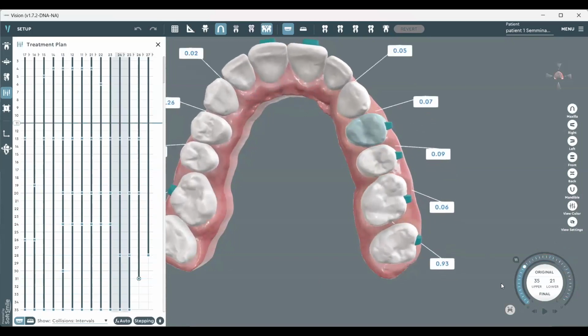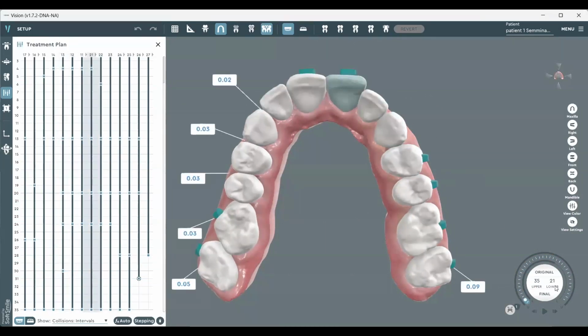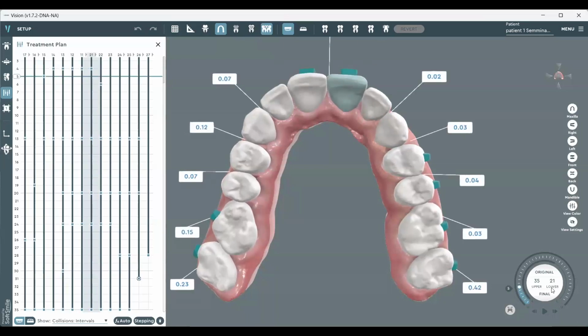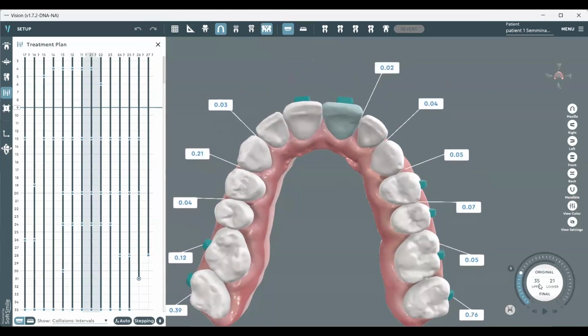What happened with anteriors? Well, with anteriors, it's important to understand that this is the thing that the patients see. They don't see posteriors, bite, they feel the change, but they cannot see. There are open spaces in the posterior area, but they don't feel like something is happening. So it's very important to start with something that we call aesthetic start, trying to improve the alignment on anterior a little in the first step, so they can see results from the beginning and engage with the treatment plan from the beginning.